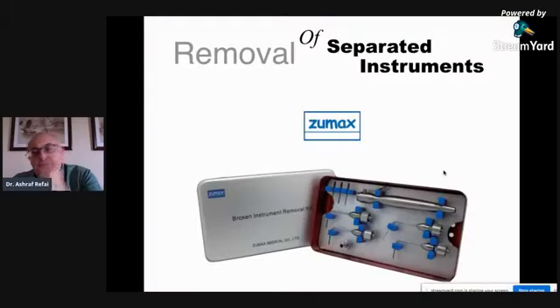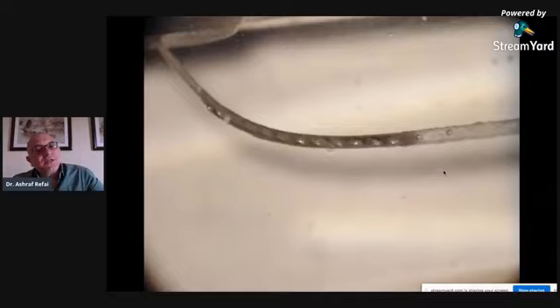And basically what a tube system is, it has a tube with an extension or a wire inside the tube, which the tube is placed over the instrument segment, and then this wire is activated and engaged so that it pushes the instrument into the tube wall, engaging with it and allowing the instrument to be pulled out as part of the tube. And I'll show you what that means right now with the system.